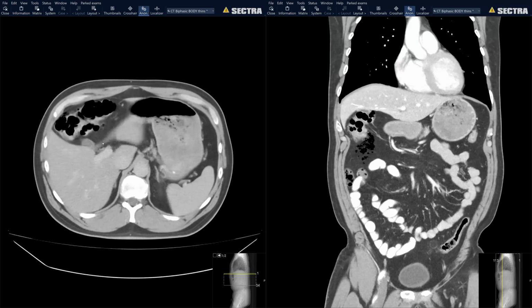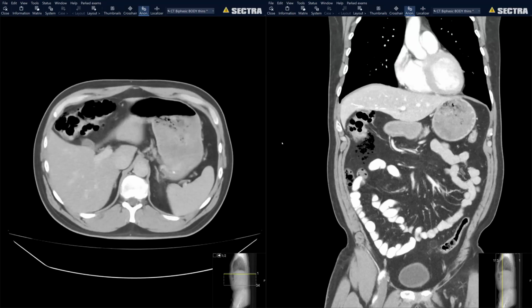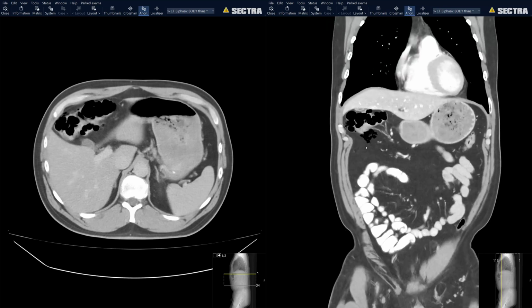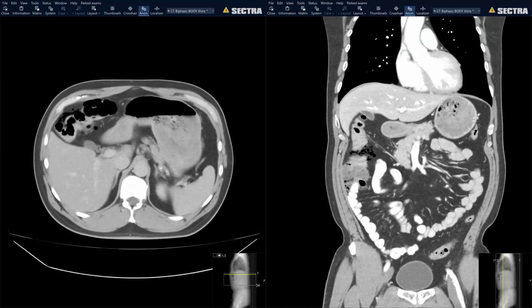When we have cystic spaces along the wall, that is benign. Sometimes they can have a serosal cyst that can rupture and may have a trace amount of free air, but that's still pneumatosis coli, which is benign. We should not think of perforation. And whenever we have linear air, that is concerning for bowel ischemia.